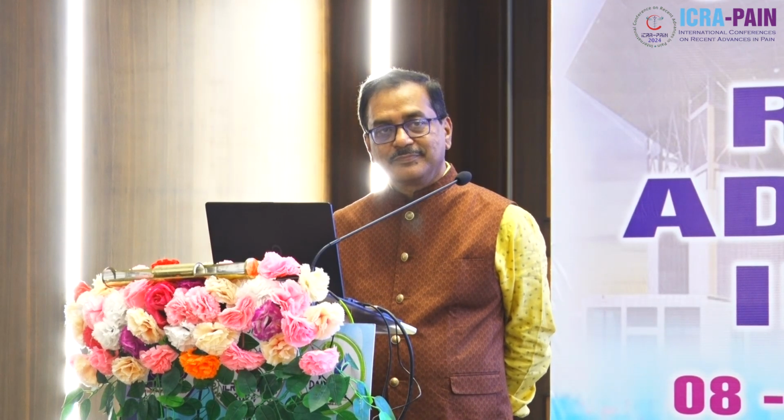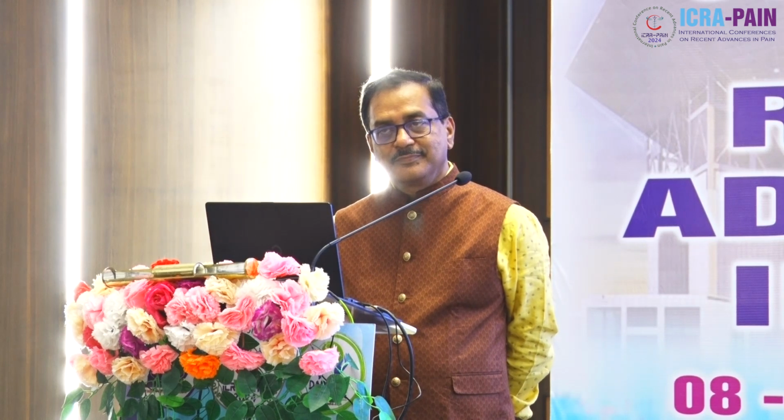So this is the site you have to go to, and it will be asking for the login ID, that is a@b. And all of you have logged in. Shall I proceed? No, have you logged into this?